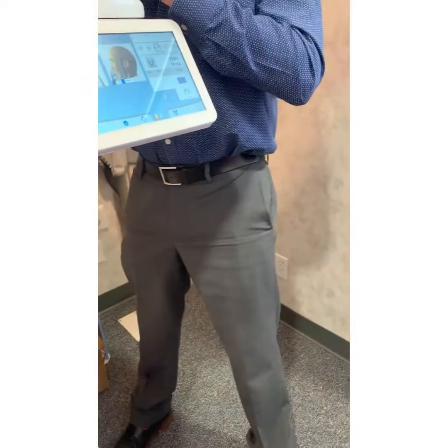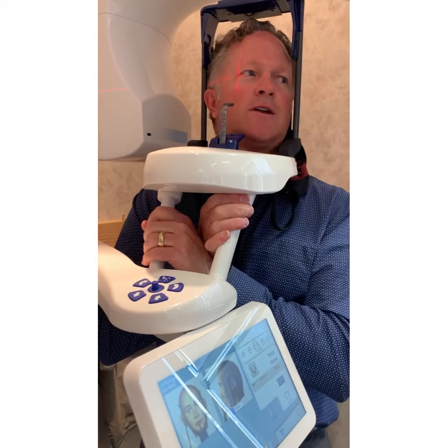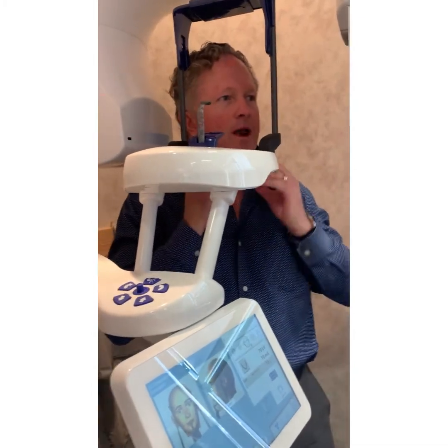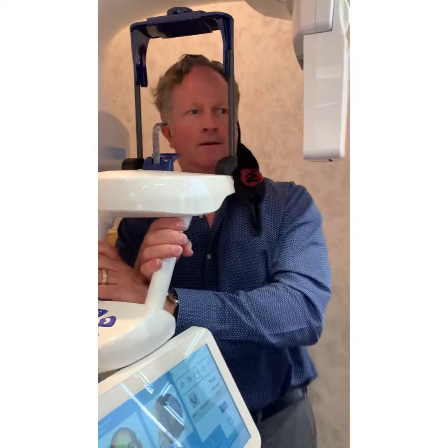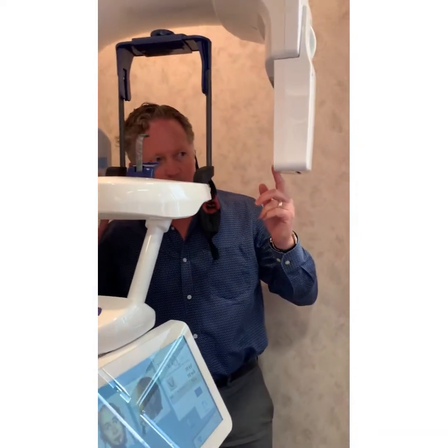If you see my shoulders, if you have a big broad person in here, if I cross my hands, it brings my shoulders forward and down naturally. So this works with big broad people. With a smaller neck span, we did have trouble sometimes with clipping the shoulders, because it'll rub. It caught more on that shield than it did there. This is a pretty big expanse, bigger than most.